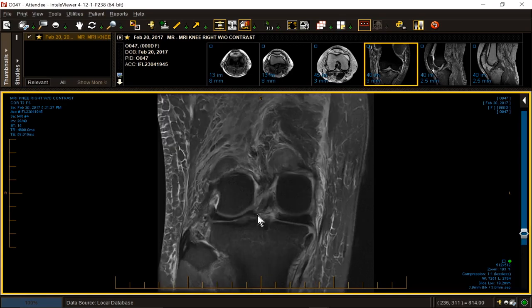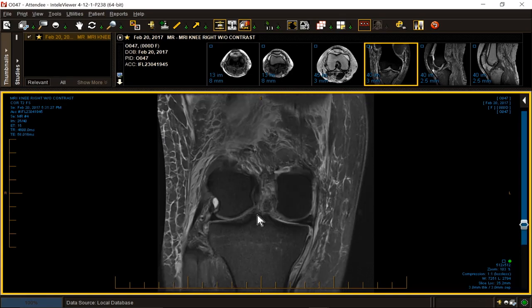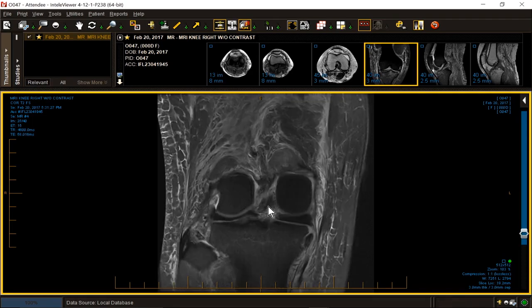Root tears are extremely common, but sometimes in active young individuals, if they occur and they're left unchecked or the patient is not rested, then the meniscus starts to gradually spit out and extrude and become unstable over time, and they end up with secondary disease. In this case, it's a pimple on a donkey's rear end compared to what we have.